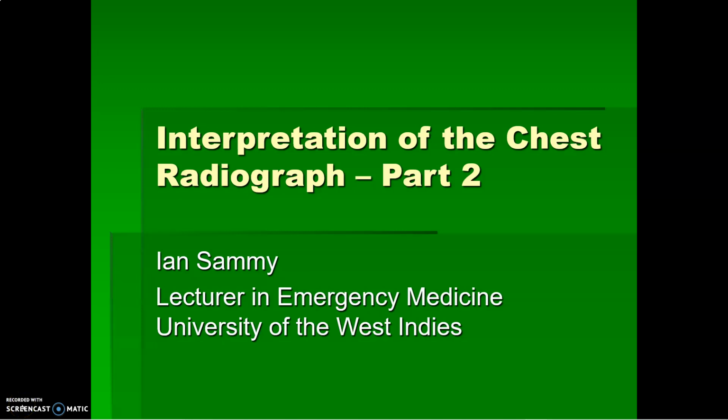In this second talk, we are going to look at some clinical scenarios and the related chest x-rays and talk you through some common abnormalities you may find on x-ray. Before we start, we're going to be going through several cases fairly quickly, and therefore what I would suggest you do is, when we show the first clinical scenario, each clinical scenario with its x-ray, you pause the video so you can take your time to interpret it.